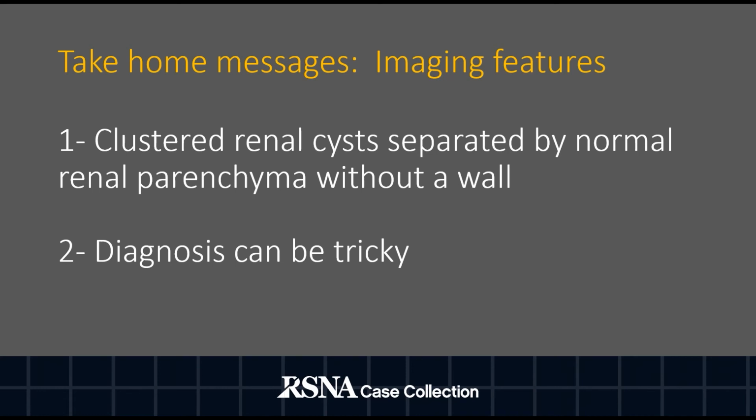However, in real life, the diagnosis may be tricky in that the intervening renal parenchyma may be so thinned out that it may simulate enhancing septa of malignant cystic renal lesions. Second, tight spacing of the cyst may also obscure the evaluation of a cyst wall. It is suggested in the literature that evaluating the kidney in the coronal plane allows for better visualization of the normal insinuated renal parenchyma.